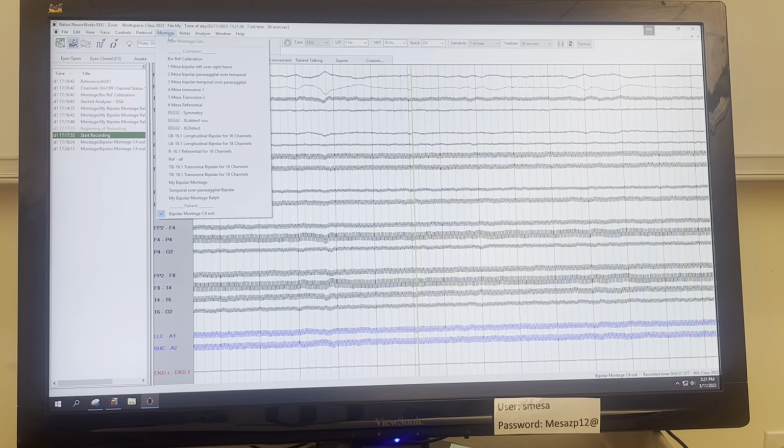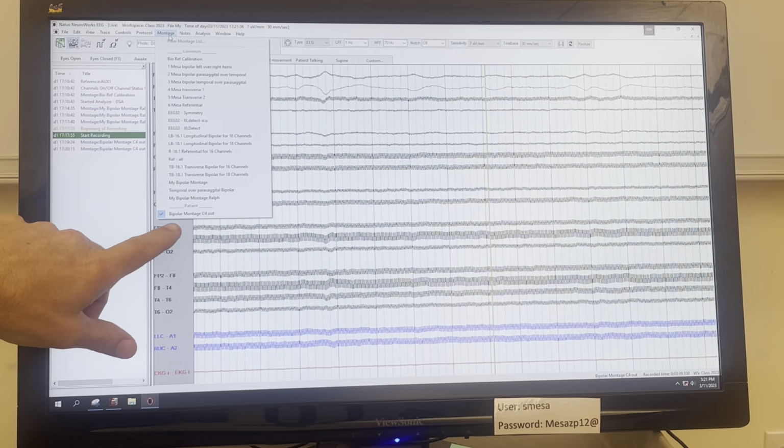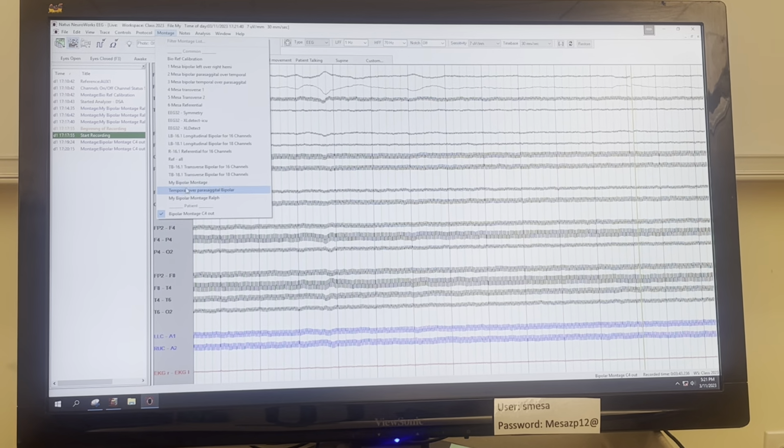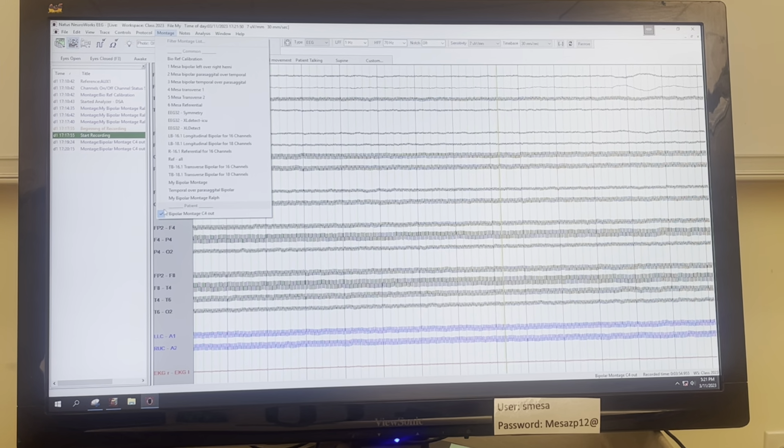And then here's your montage. Here's the montage that we created earlier from scratch, right here. Okay, so that one's preserved in the common montage menus, okay? But this one here is very specific to the patient, okay? So that's how you copy and edit a montage.